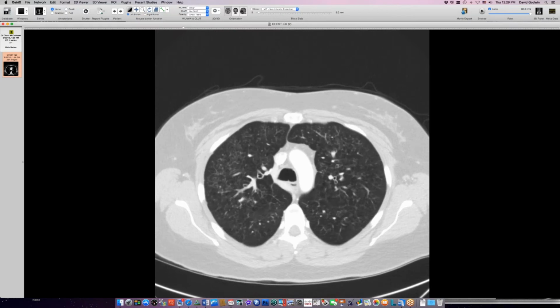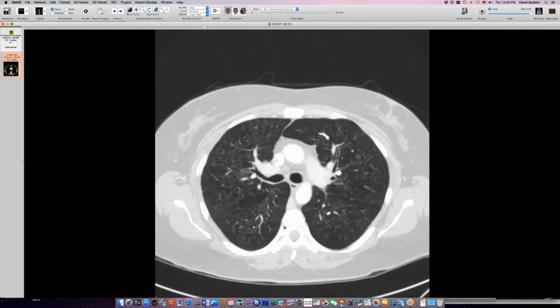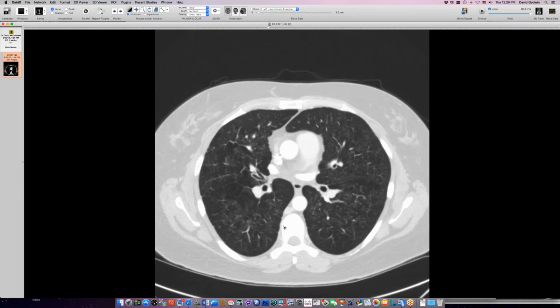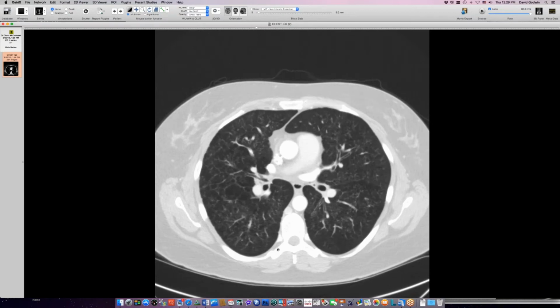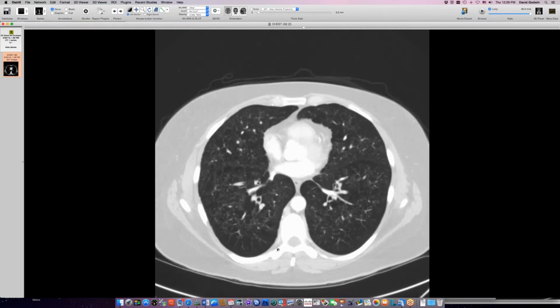I mean, there's emphysema in there, but I found that in any advanced cystic lung disease, the preservation of the pulmonary vasculature is very helpful. You see that in LAM too. So you think that most of these holes are probably cysts rather than emphysematous spaces? Yes. I think she's got bubbly lesions. Septal emphysema, I mean, there's definitely both, but when I see a patient with hyperinflated lungs with lots of holes in them but relatively intact vessels, I favor it being cystic disease primarily. Good point, interesting.